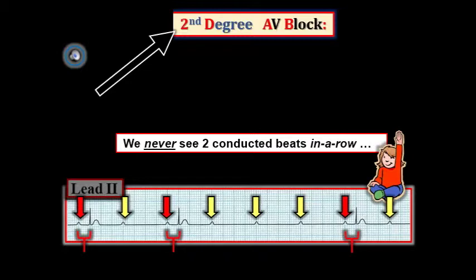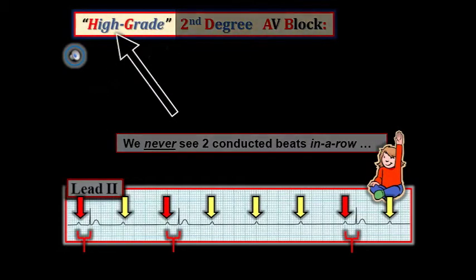That said, regardless of whether this example of second-degree AV block is Mobitz 1 or Mobitz 2, consecutive non-conduction of P waves with the resultant slow ventricular rate produced here is of concern and may require pacing unless the ventricular rate can be increased. In such situations, we find use of the term high-grade AV block a convenient way to convey concern for selected cases of AV block that otherwise defy classification.